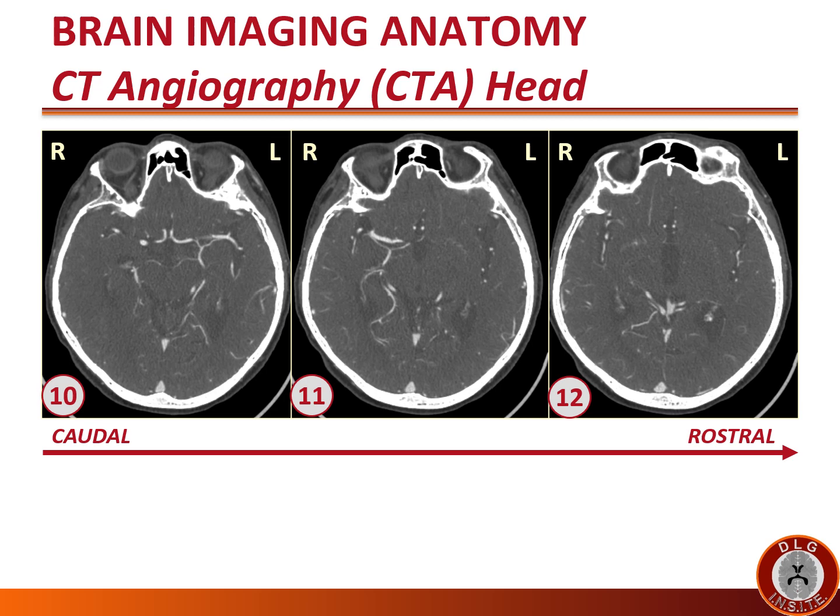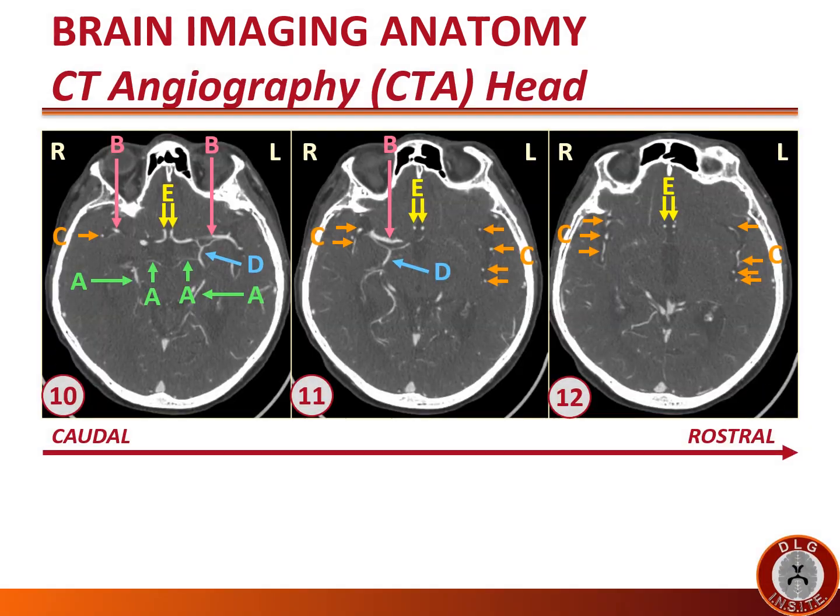For CTA head images 10, 11, and 12, we are moving even more rostrally. Can you identify the main arteries without the assistance of labels? Can you identify the arteries labeled on this slide?